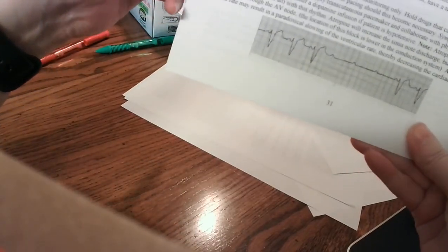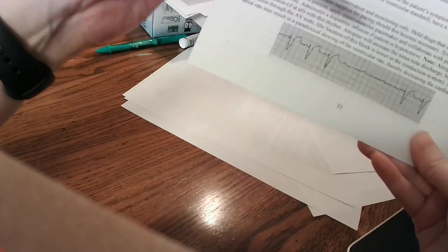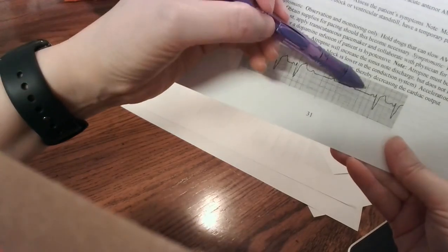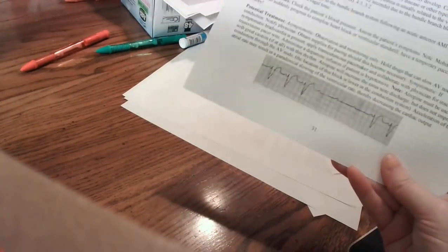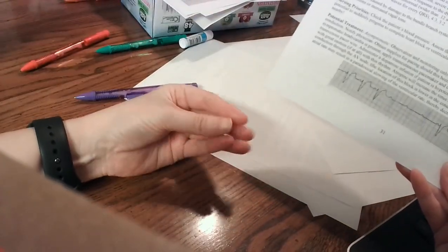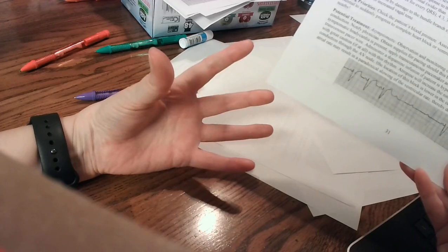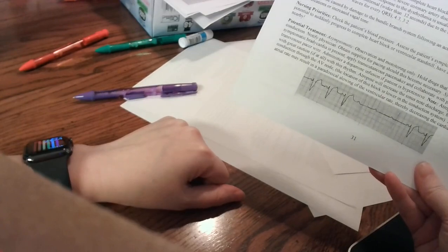Normally when you see this, you'll see 3 or 4 beats that look pretty normal, and then you'll just see a P wave at the correct distance, but it doesn't trigger any ventricular contractions. And that's why this is a more dangerous heart rhythm, because it can have several beats in a row where you don't have a QRS. The ventricle is squeezing, pew, pew, pew, and the atrium is still trying, but the ventricle is like, nah, I need a minute, and then it comes back in. And this isn't necessarily in a regular pattern. It's just going to be the dropping of beats.